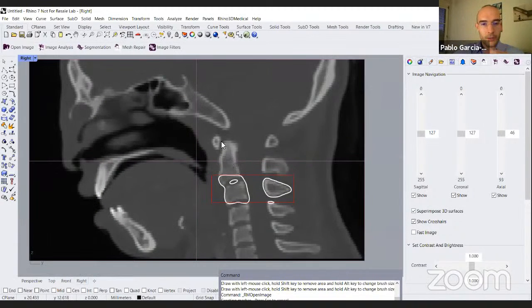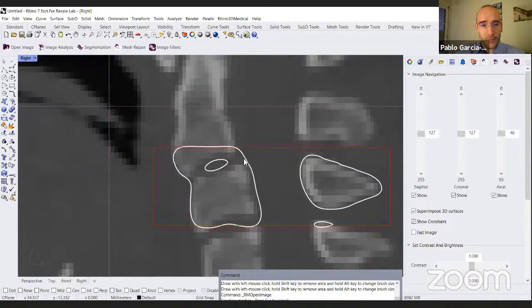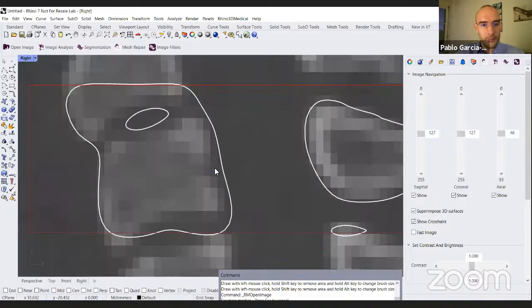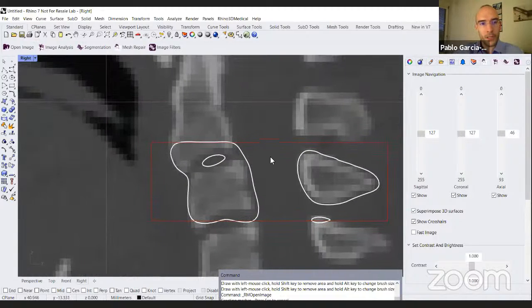You should go over your mesh model the same way I'm showing you on the CT. Here, for example, I show the intersection of the mesh with the model, and you should go over every slice of the CT and check that there's no soft tissue that is really exceptional over the mesh. But this is normally something very important that the doctors clean a bit before operating, cleaning a bit the spinous process.